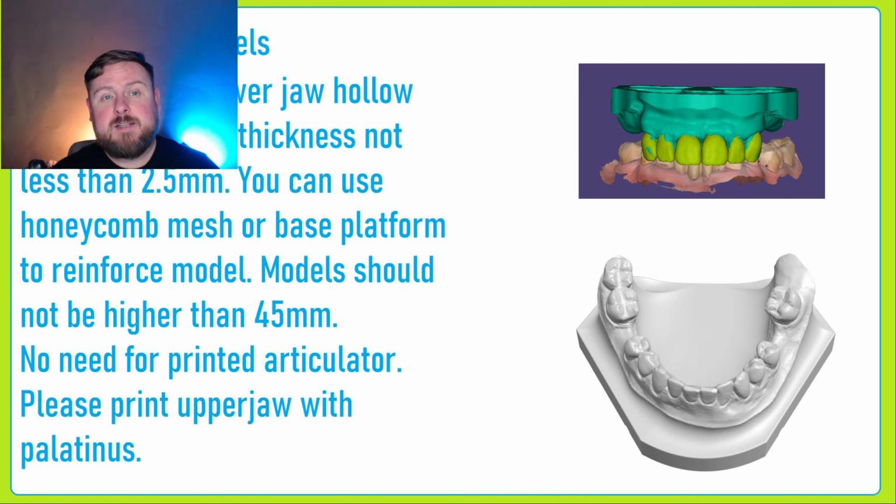And don't forget to send the generated 3D printing models like you would do in a real job. So the doctor or your friends or you could print the models and make a transition of the wax up as a mock-up in the patient's mouth.